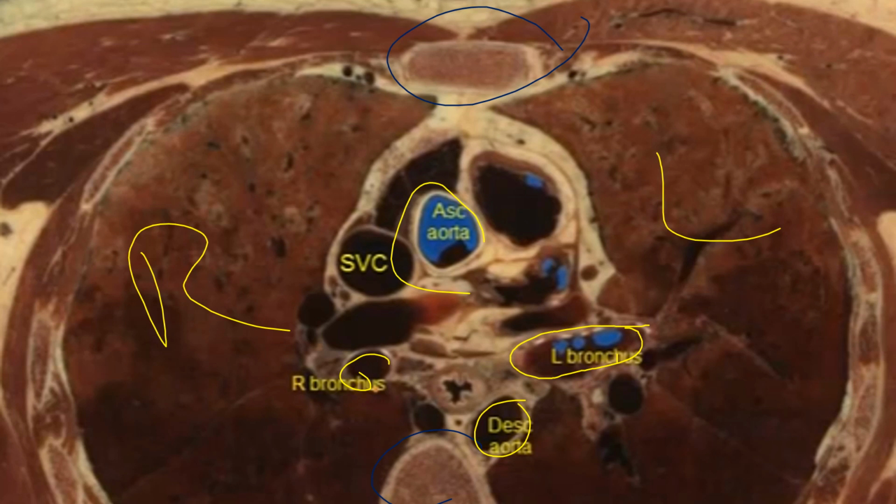Why is that? Think back to pulmonary. What are the angles of the right and left mainstem? Should be 25 and 40 to 60 respectively. So this one's going to look more like a circle. Then your left one's going to look more like an oval, because remember, it's a flatter angle. It's that 40 to 60 degree angle depending on how tall the person is, but that right mainstem's usually around 25 degrees or so. So that's why they look sort of different there, and that is one way to sort of start telling the difference as well.